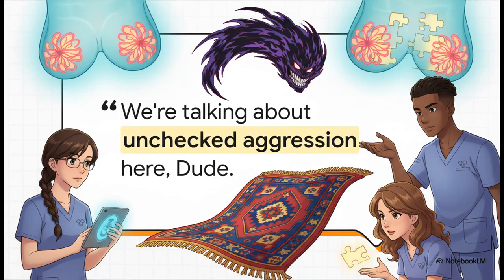Yeah, I know what you're thinking. Sounds like it's straight out of The Big Lebowski, right? But believe it or not, that's how our source material talks about this finding. And you know what? It's perfect, because architectural distortion, we'll just call it AD, is exactly that. It's a sign of potential unchecked aggression inside the body. And it's a puzzle radiologists have to solve.